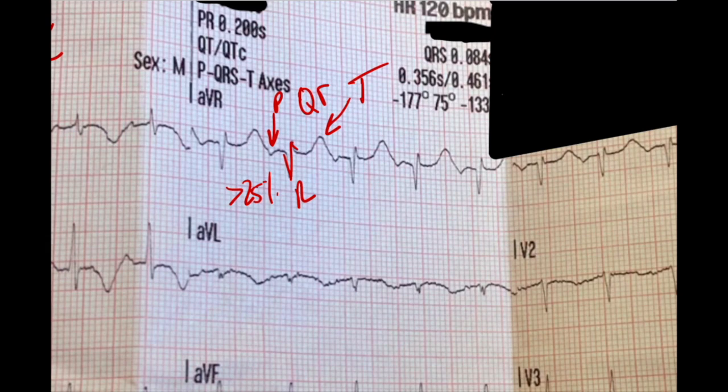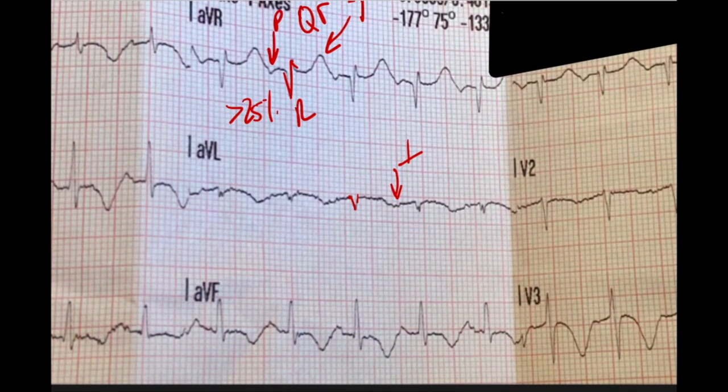AVL, typically inverted P wave, which is a little hard to discern. But it's mostly a negative complex, which we have with this QS complex. And we have inverted T waves, which we know to be fine as well in AVL. AVF. Here we see we have that positive P wave. We have an RS complex. Tiny Q waves, sometimes not present really though, but that's fine, that's normal. And then here we see we have that inverted T wave, which is not particularly fine or normal. That is a pathological finding.